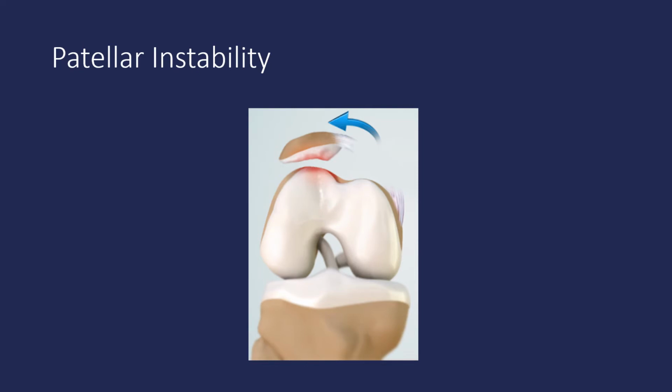Let's transition now to the osseous structures about the patellofemoral joint that may become affected by a patellar instability injury, more specifically bone edema of the patella and the lateral femoral condyle. Osteochondral lesions can also occur, but we'll touch on those later on.